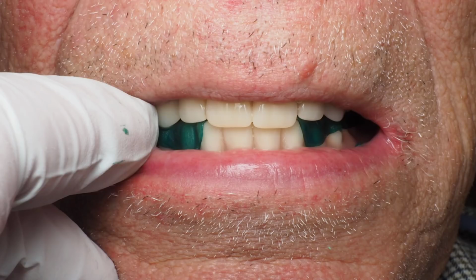And for delivery, it's inevitable, just like with conventional processing, the teeth can move ever so slightly. There's about a 0.2, 0.3 millimeter offset or slop space between the tooth and the socket. So you've got that much wiggle room that you might over or under seat the teeth when you're processing these in. So you've got to check occlusion, that's inevitable.